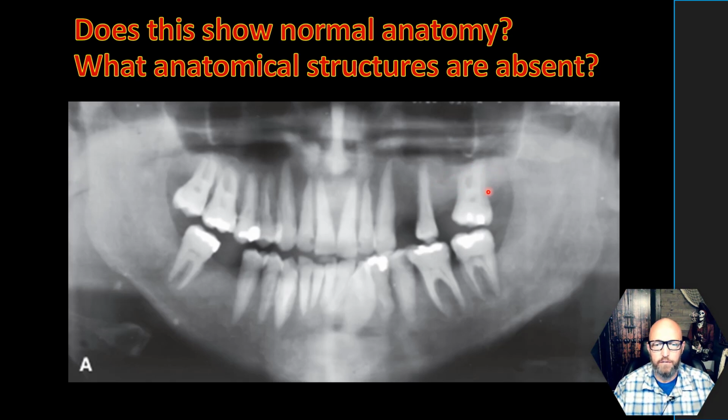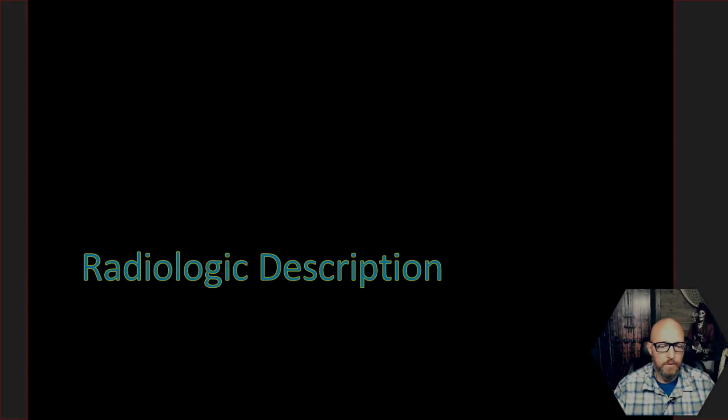That's one of the more specific descriptors that we're going to use in radiography, but it's generalized, meaning it's all over the bone, probably all throughout the body, but all we see here is the jaws. And so this is a generalized condition. Multiple anatomical structures are missing on either side. In this case, it is symmetric, but there's some metabolic change or some systemic change that's altering the bone in this patient.